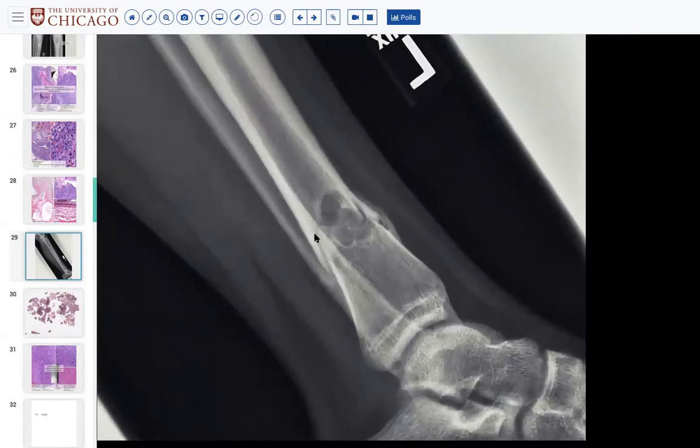And this is a good radiograph to remember, especially for boards' purposes, that NOF is a very, very common cause of pathologic fracture in kids, from this underlying lesion that is benign, yet still weakens the bone and causes fracture. You can actually see this very nice sharded bone at the edge here that's fraying out.